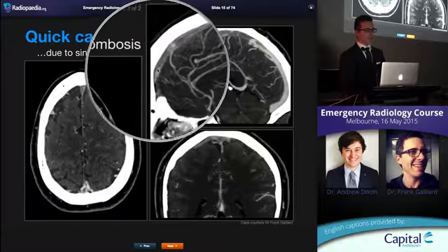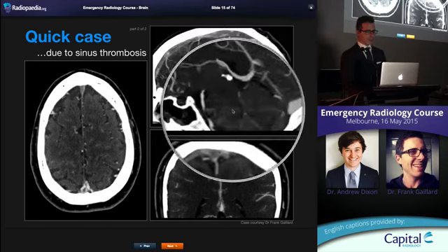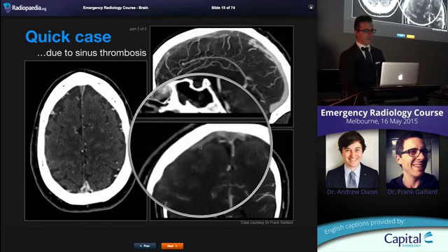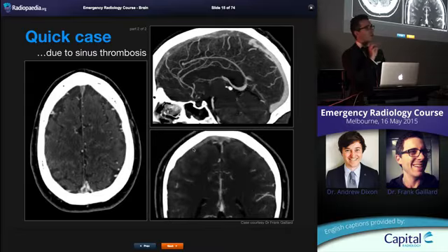And so this patient had a superior sagittal sinus thrombus up to here, which also extended out into that cortical vein, which was the area of the brain that then still had arterial inflow, but didn't have venous outflow, and something burst. And that's why it's often multiloculated, because multiple vessels burst.